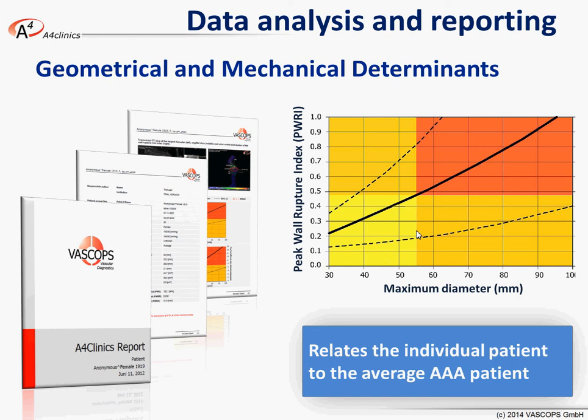Now coming to the data analysis and reporting steps. Here geometrical and mechanical data is reported and output in an analysis report. And here again, the individual case is related to the average patient using this evaluation chart, where the individual patient can be seen with respect to the average patient.